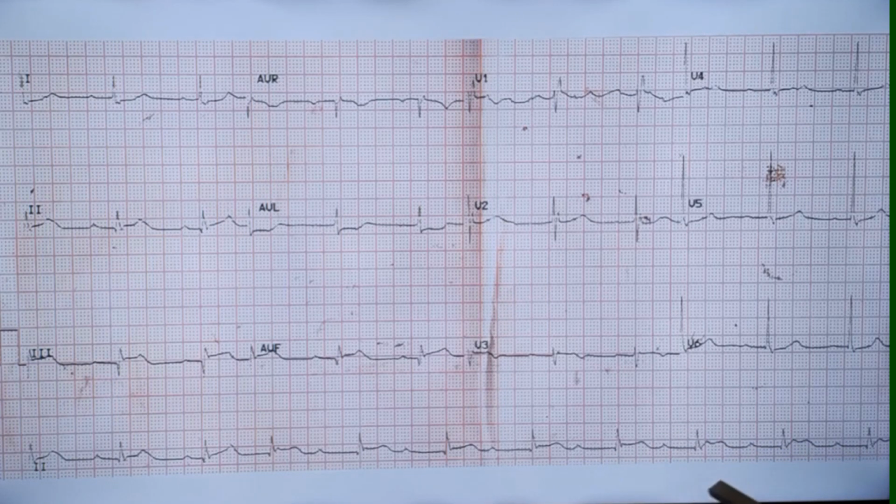But there are abnormalities here, you can see here. On the ST segment, you don't expect ST segment to be like this, a humped ST segment. Here also it is there. Here the ST segment is flat. So you have to cautiously look for the P waves which are probably not visible on first look.